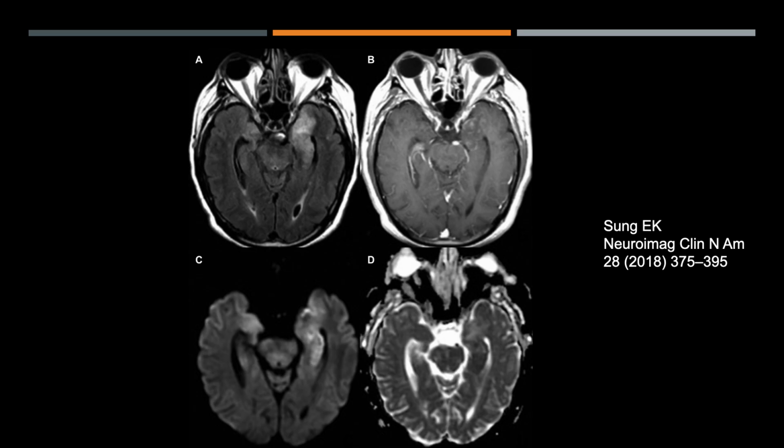We have hyperintensity and some mottled enhancement throughout the anterior temporal lobe medially involving the amygdala, the hippocampus. We have some restricted diffusion. What is your diagnosis? This is herpes encephalitis. This is one that you want to really consider because there is treatment. We could start acyclovir. So always think about this with temporal lobe involvement, so that the right treatment can be started right away. One to remember for the ER.